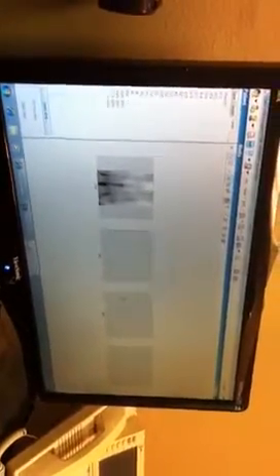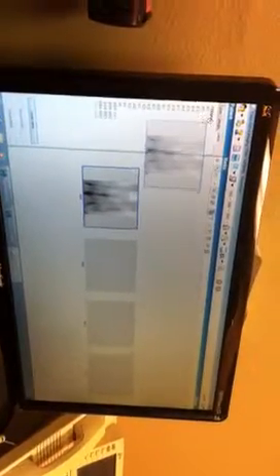Okay. All right. And then in labels, you can go ahead and label certain things. So if you want to create a label, you can click create a label. Let's create one right now. Let's say fracture. So here, I can click this image and drag it to the fracture label. You see how I'm doing that? So when I bring it over to fracture, it's highlighted. It says one image has been tagged with that label, right?